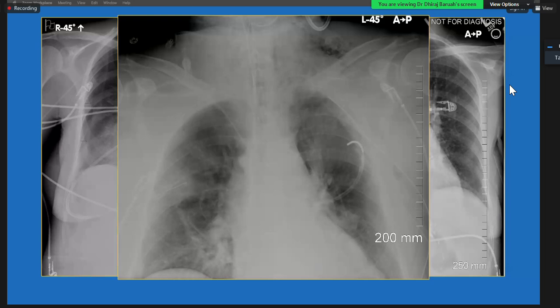But I thought this will give you some idea how to look at the chest X-ray, what the normal structures to look at are, how to identify abnormality and its location, and sometimes try to characterize those abnormalities by giving different terminologies like airspace opacities and interstitial opacities, and also identify structures going to an abnormal location, like in these chest X-rays where you see the gastric tube going to the bronchial tree.